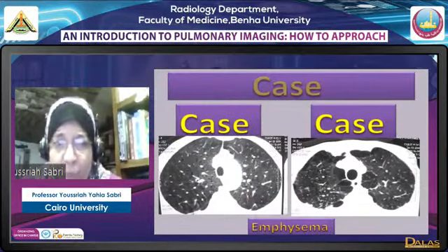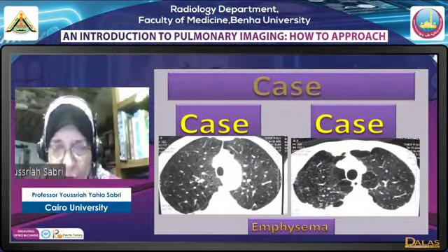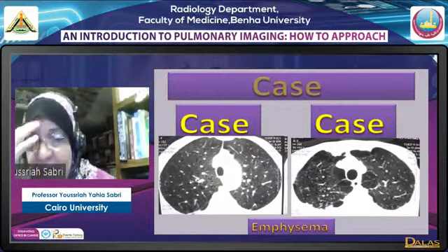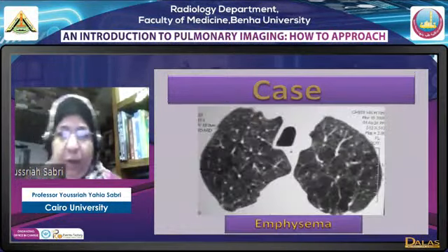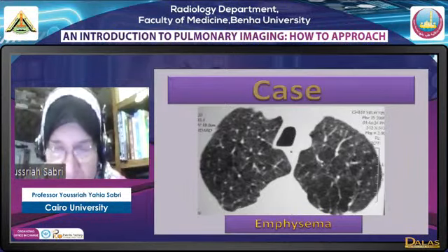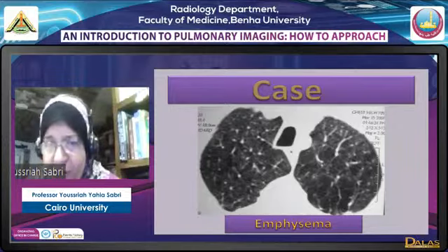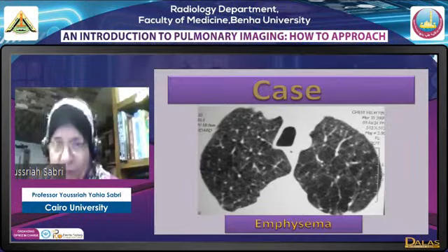Again, emphysema is a small airway disease, don't forget this. Here on the left side, we have central lobular emphysema, holes without walls affecting the upper lobes. On the right side, we have holes without walls and peripheral bullae and blebs, paraseptal emphysema. Now here we have in the right lung central lobular emphysema, and in the left lung, as you can see, there is marked hyperlucency affecting the whole of the secondary pulmonary lobule. You can see the wall of the lobule now.